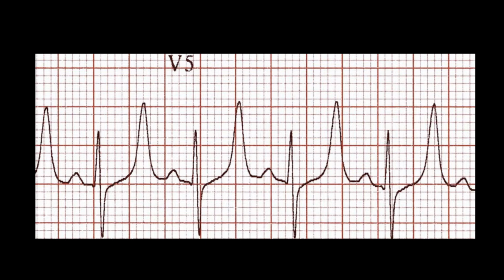Now again, this isn't necessarily correlating to what the actual serum potassium level is. You can see this develop quickly. Sometimes it develops late and maybe not quite as high of a potassium as you may think. So here's an example here of a peaked T wave.